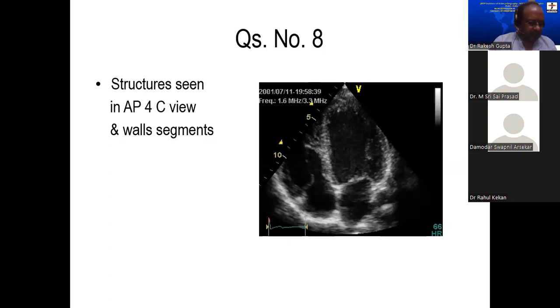Now this is for Dr. Krishna Yadav. Dr. Krishna Yadav. Yes, sir. Identify segments. What is this? What view is this? This is the apical four-chamber view, sir. How do you make the apical four-chamber view?